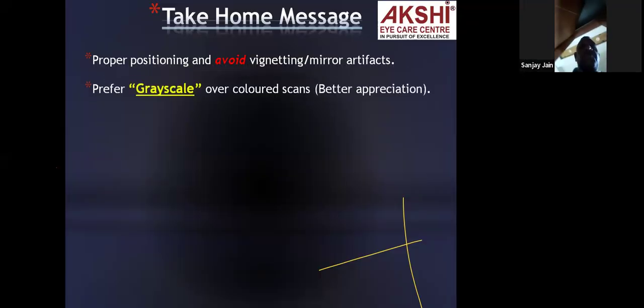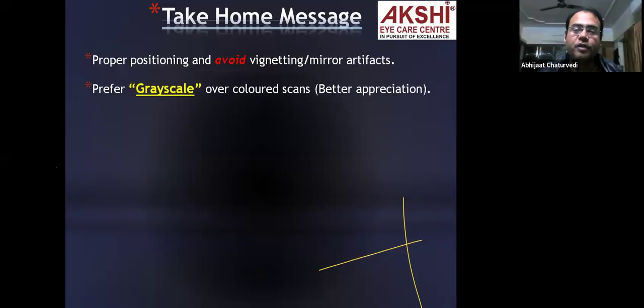I personally prefer grayscale images, because in such grayscale images there's a very good appreciation of the different layers, which I don't tend to find in the colored images.